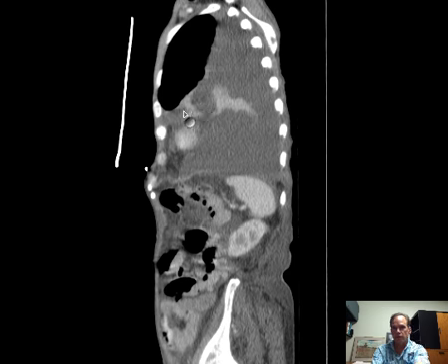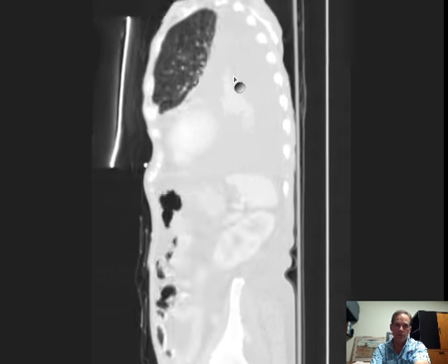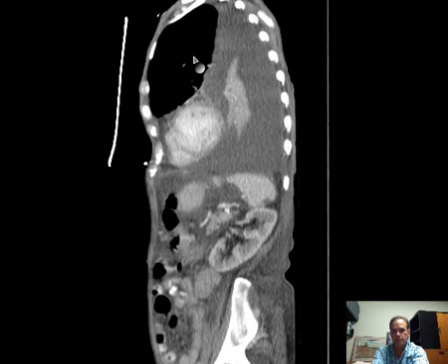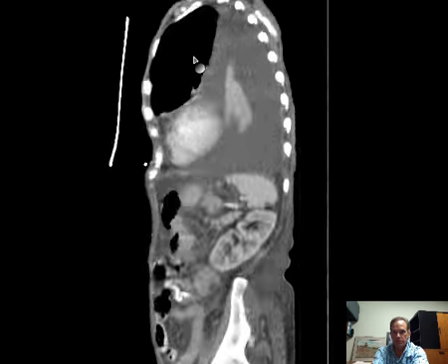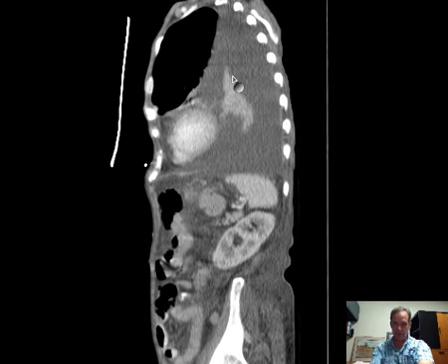So now you can see that the left lower lobe is atelectatic. The lingula of the left upper lobe is atelectatic. But like on the right side, most of the upper lobe, the left upper lobe, is fairly well aerated without any really clearly demonstrated atelectatic portions. So that is a summary of the anatomy of the lobes, and it's a depiction of the typical appearances of atelectasis of the lobes of the lung.